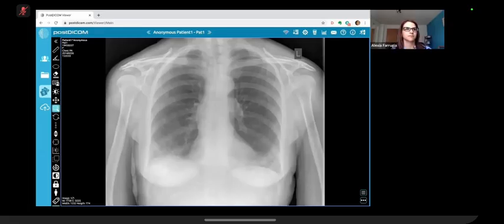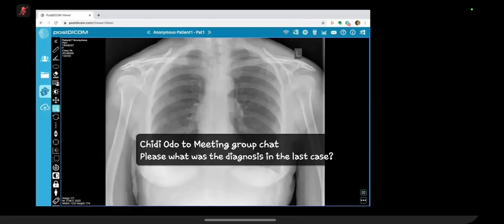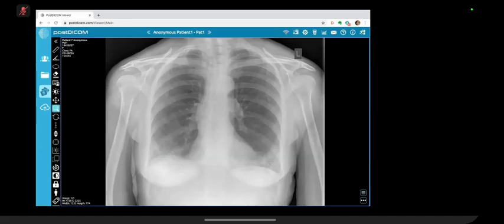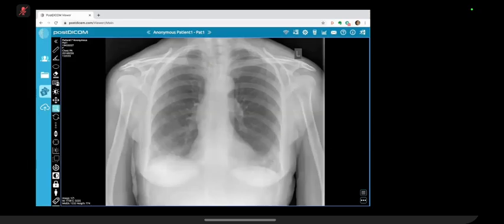It's a frontal chest radiograph of a 75-year-old lady with increased work of breathing, which is demonstrating bilateral low zone reticulonodular shadows, more predominant on the right side, involving the costophrenic angles as well. I cannot see any pleural effusion. Heart size appears normal. Rest of the lung appears normal as well. The bones appear unremarkable on this chest X-ray, and the hila are not enlarged. Normal AP window is preserved.